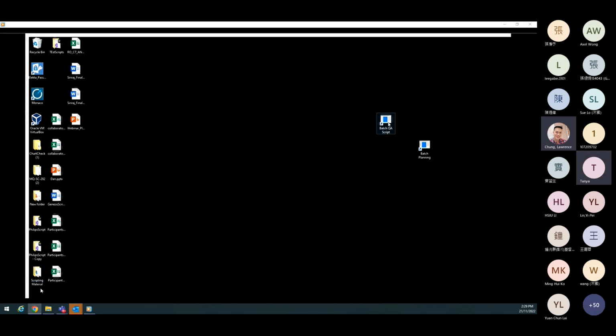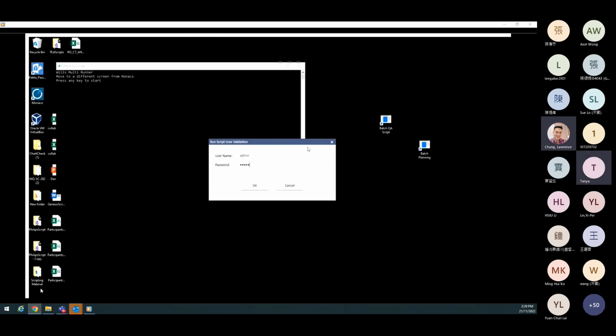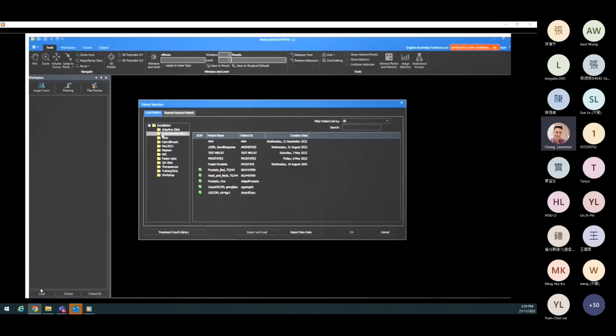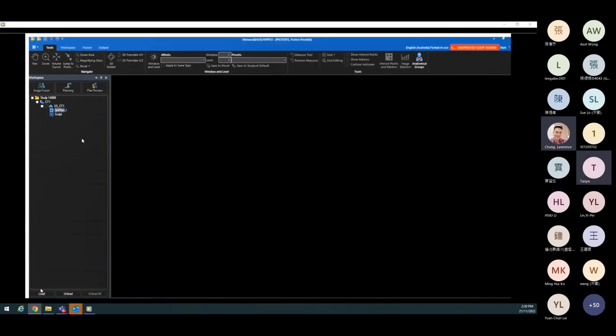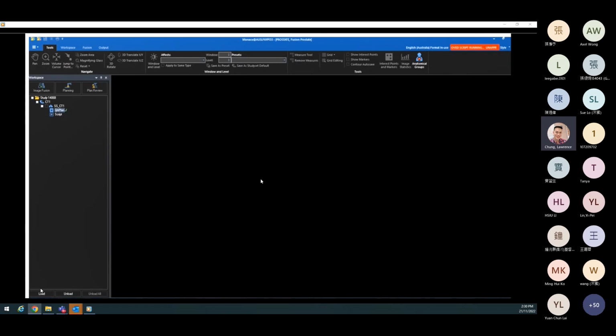It can also do QA planning for you. So again, just taking a list of QA plans that need to be done, opening up those patients and those plans, and then being able to run those through. So all those things are, I suppose, repetitive tasks that really allow you to have those be done automatically. So you can see it'll load the QA plan, it'll assign the phantom, it'll set the calculation properties, and then run that through.